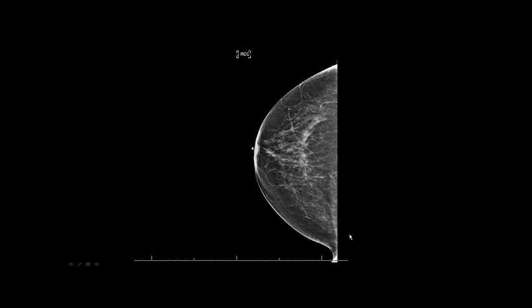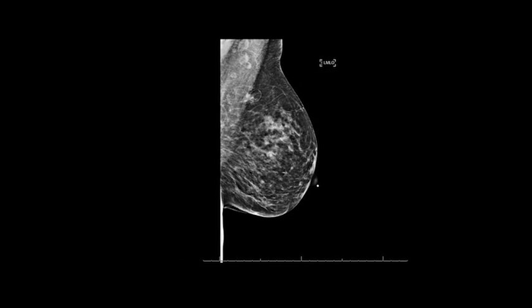This is very, very medial. I don't know if I would send that in. You definitely would get docked on it.